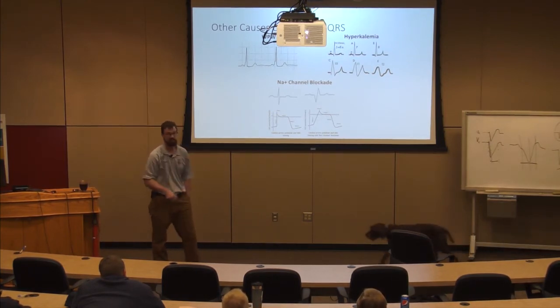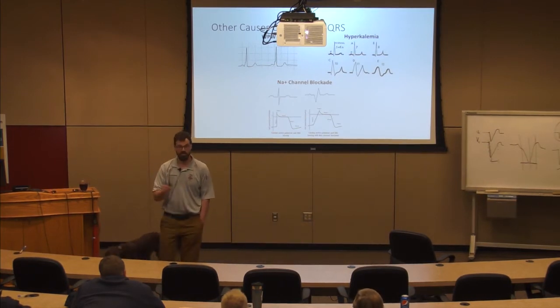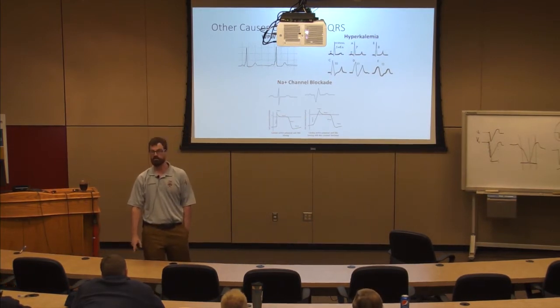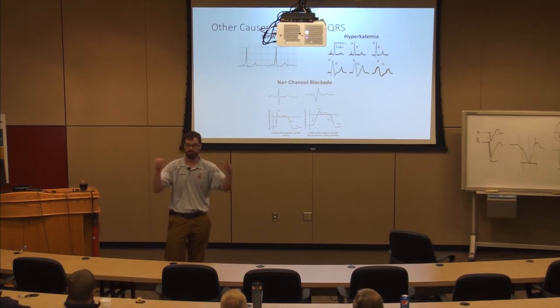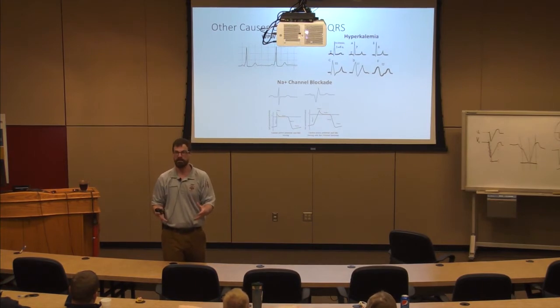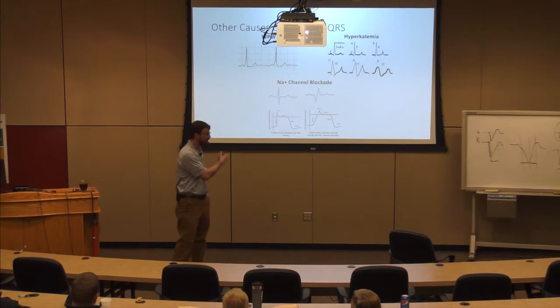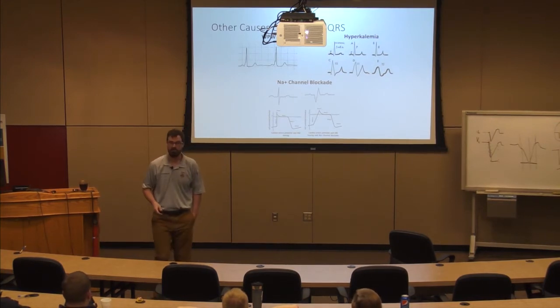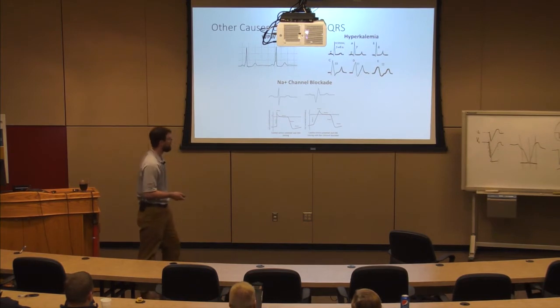Everybody sees this and they say, oh, looks idioventricular, right? Beware of showing up and calling something idioventricular. Because what's idioventricular? It's this junk box of, I don't know what it is. So I just put all this slow, wide stuff into one box and I call it idioventricular, right? So be wary of calling things idioventricular. Think hyperkalemia, okay? Think digitoxicity. Right? There's a number of different things that can do it.